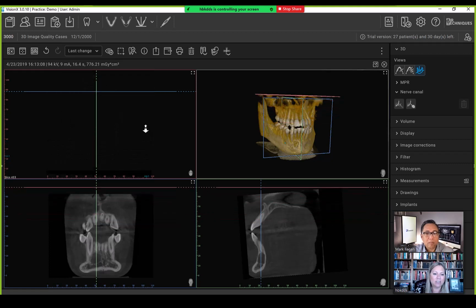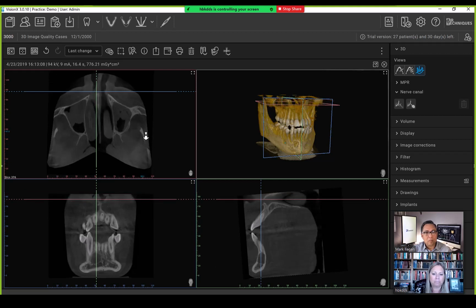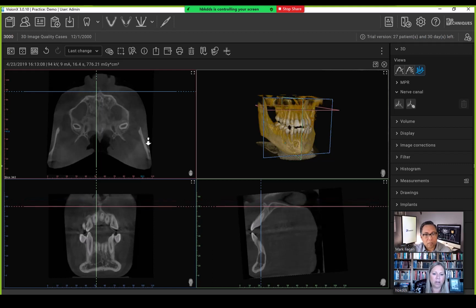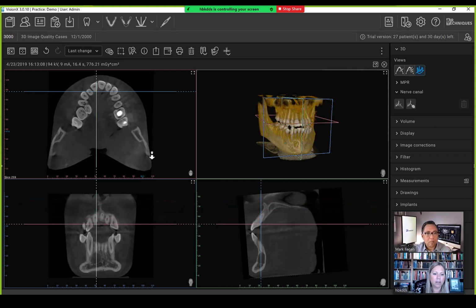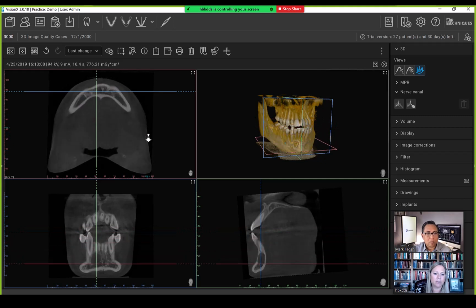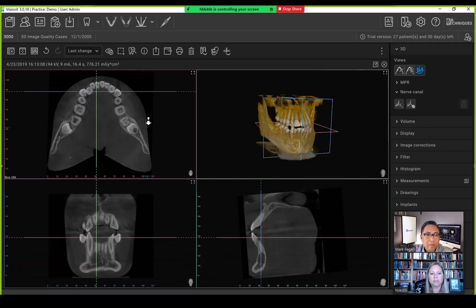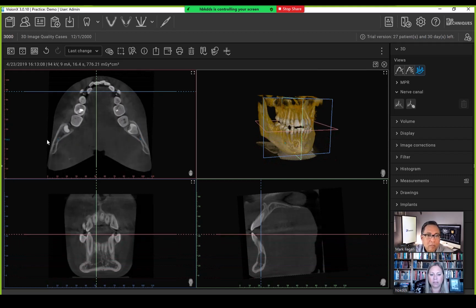All right, and once I've reached my top, I can just do a quick review, looking at that most posterior aspect, even though I don't have that cervical spine. And all the way down, just making sure there's nothing going on in the soft tissues on either side. Okay. All right. So that's my look in my axial sections.